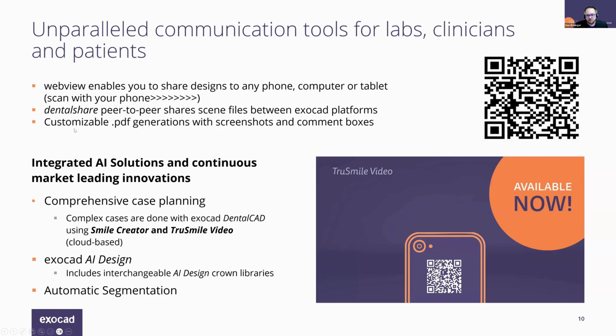The software is automatically going to detect that those customized screenshots were taken and add them to that automatic PDF. So it's really taking the communication to the next level and making it a lot more clear to your customers what you're trying to show and what feedback you need.